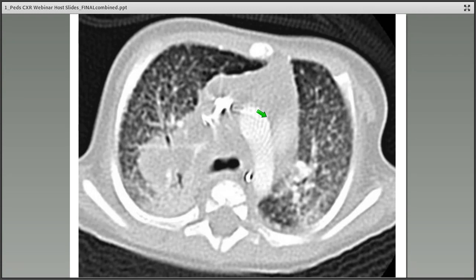On the lung window, you can see that the patient has diffuse small lung nodules. A lot of these nodules stud the peripheral pleura. This is classic for random nodules caused by hematogenous dissemination of the infection. Nodule along the pleura.